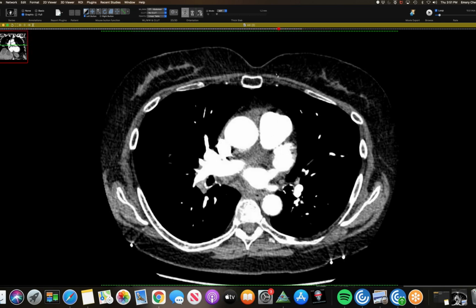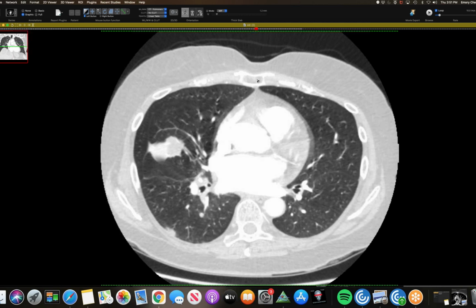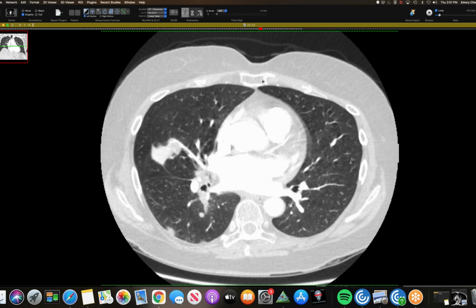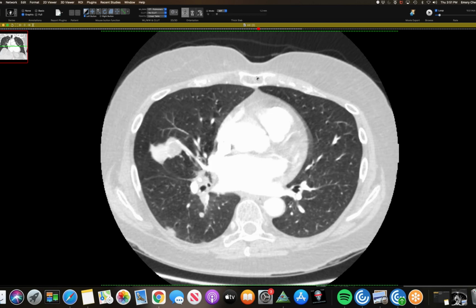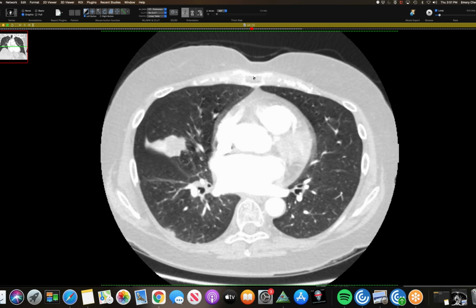I wonder if that was the cause, because if I remember correctly, you can get a post-obstructive lipoid pneumonia because of surfactant breakdown products. I don't know if the pathologist is able to comment on that when they sign these out, but it makes you wonder, because like Travis was saying, all the lipoid pneumonias I've seen have been very stellate, spiculate. I mean, very ugly looking. And this is pretty well circumscribed. So this could just be post-obstructive. Oh, that's a great case and a good reminder.